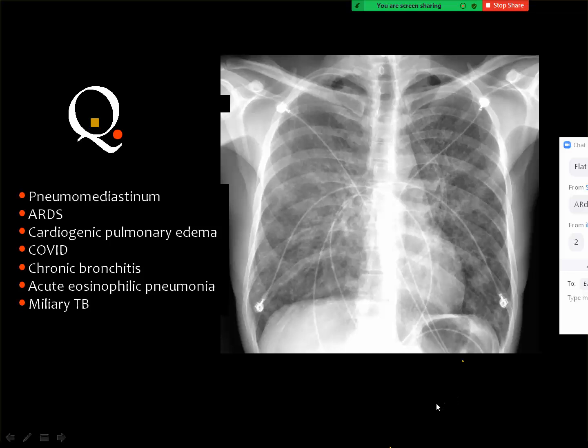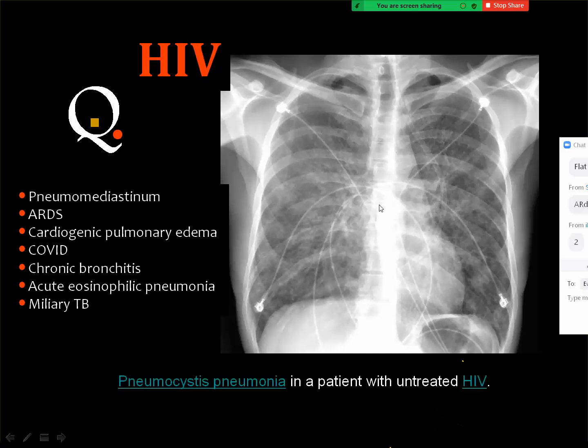ARDS, and this patient is known to be HIV positive. Then the answer will be, why not COVID? Yes, the answer will be this type of pneumonia, pneumocystis pneumonia.